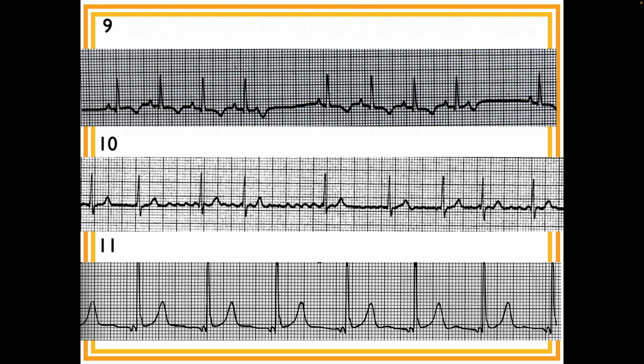What's happening here is that we have our normal sinus rhythm, and then there's an ectopic focus in the atria that is really premature. It even happens at the very beginning of ventricular repolarization. So it's no surprise that it's not able to conduct, because the ventricles are in the absolute refractory period, right in the middle of it. And so that's what that is. Then it goes back to normal, and then there's another one. Does that make sense to everybody?